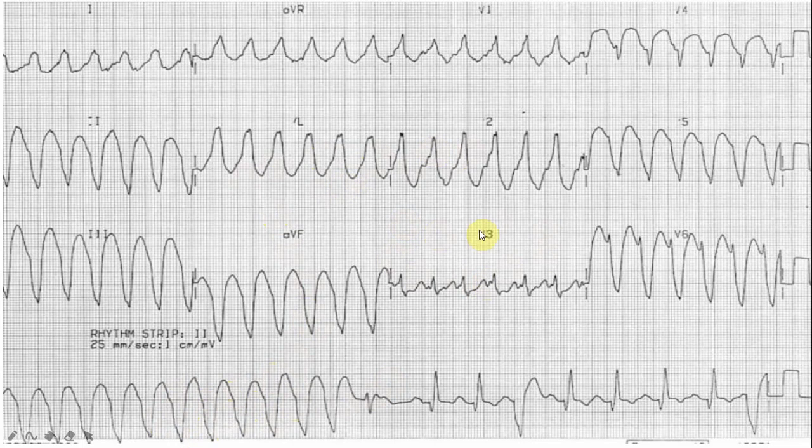The ventricular rate is about 150 beats per minute. The rhythm is difficult to evaluate as I can't see any P waves in the 12 leads. However, in the rhythm strip, there are some fusion beats and capture beats suggestive of ventricular tachycardia. The axis of the QRS complexes is left axis deviation. As I said, I am unable to see any P wave and PR interval. Therefore, I am unable to comment on the atrioventricular dissociation.